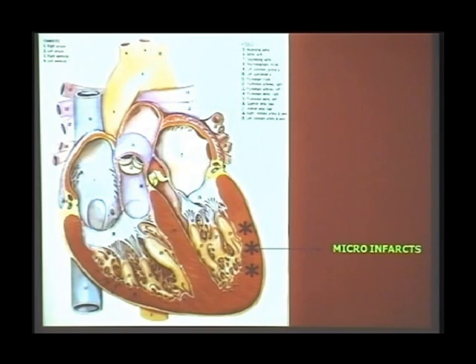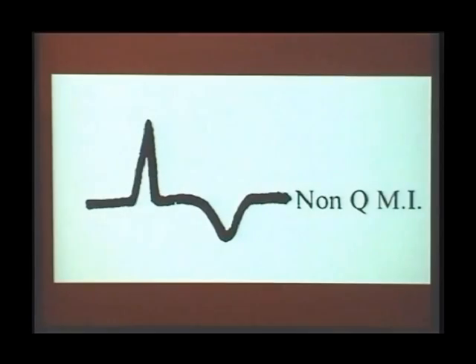But some patients may come to you without any Q wave, no ST segment elevation, only symmetrical T wave inversion. What's happening here is that the acute occlusion, before it opened up with our own system, would have produced what are known as microinfarcts. Small microinfarcts, which will be manifested as significant subepicardial ischemia.